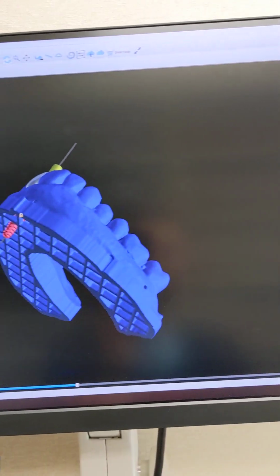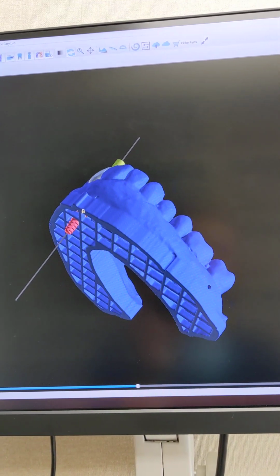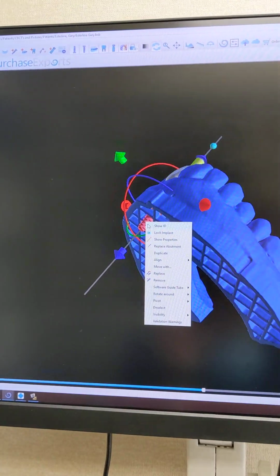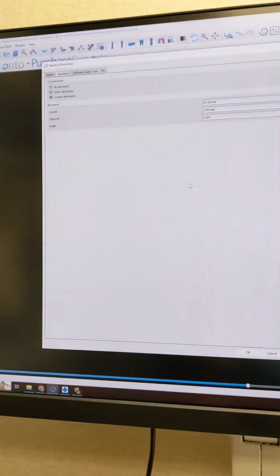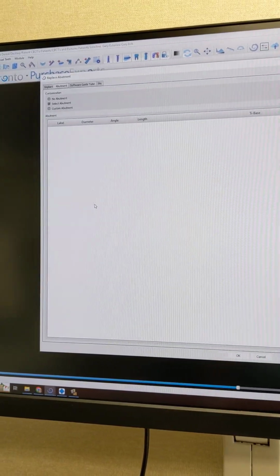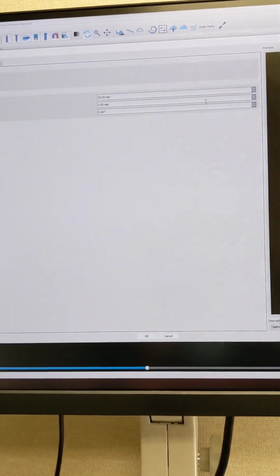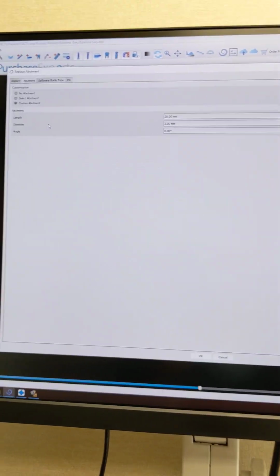in here, if you go to abutments, so if I right click, I gotta unlock my implant. Okay, if I right click, replace abutment. So there's no non-implant abutment or non-custom abutments for BioHorizons implants. So I created a custom abutment. Cool, that's no problem. Nice and long, good, so I can see it.